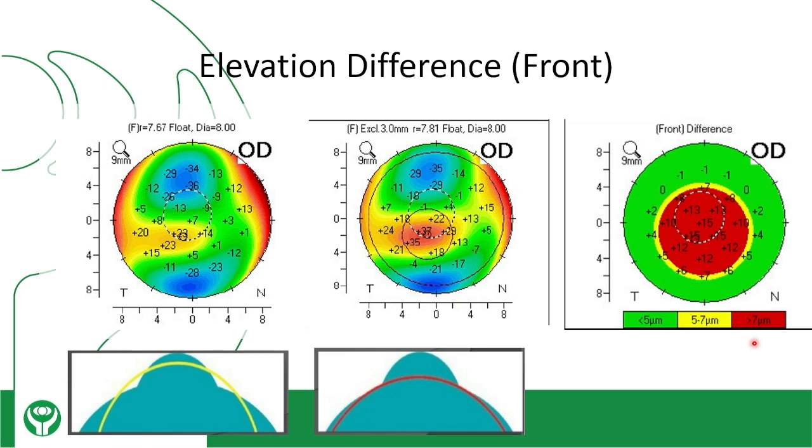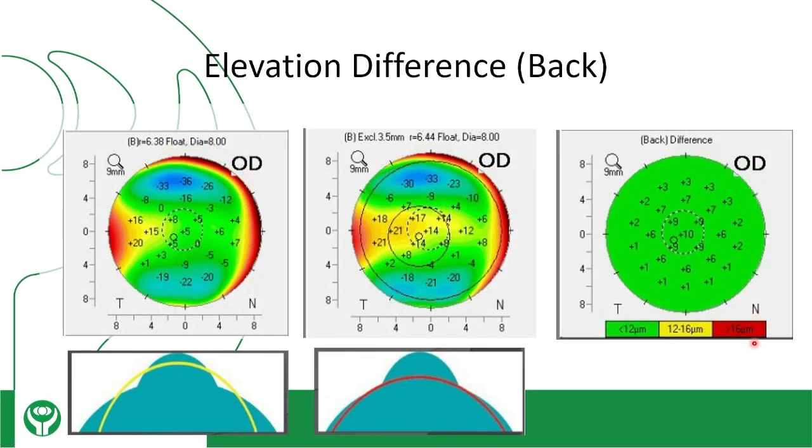A lot of the times this redness can occur because of epithelial hypertrophy. Sometimes it can occur because of contact lens use. So always, if you're not sure these patients have keratoconus, you have to go and look at epithelial data, and if that epithelial data is showing you a donut pattern, then you're sure that this is keratoconus. But if it's showing you anything else, like epithelial hypertrophy, then you're thinking dry eyes and other parameters like that. Then the same thing you're seeing at the posterior surface, the same difference.